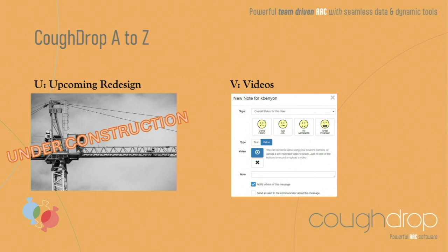Then videos for V. So in V we have videos. We have an option where you can record a video and send it to the caregivers or the team. So if there's something exciting that happened within your session and you want to share it, you can record it within the app and share it out. If you want to give mom and dad instructions, so yes, we're doing verbs, we're working on go, stop, take the car, hit this button, move it here, hit this button. So then mom and dad have an idea of what's going on in the therapy session and they're able to incorporate those things at home. Videos tend to go a long way with carryover.